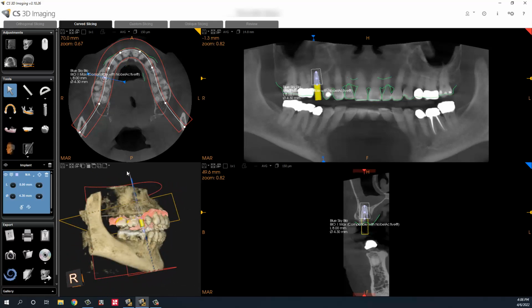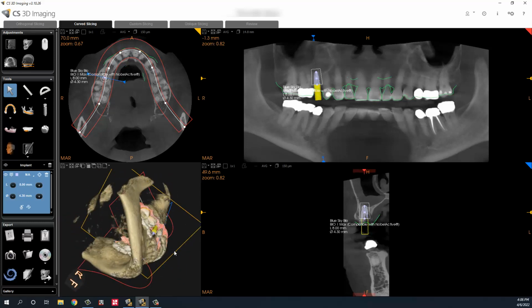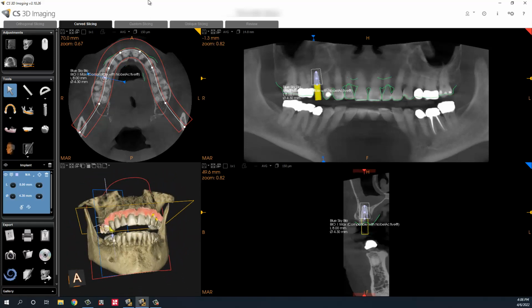So now I've talked to my patient, I've explained, see, this is where the implant's going to go. We're going to do a sinus lift. Here's where you align the model and bring that all in. I don't have to export models and bring them through STLs and everything and export the DICOM, because right from here I can click right down on this button. When I click here, it's going to open up BlueSkyPlan.